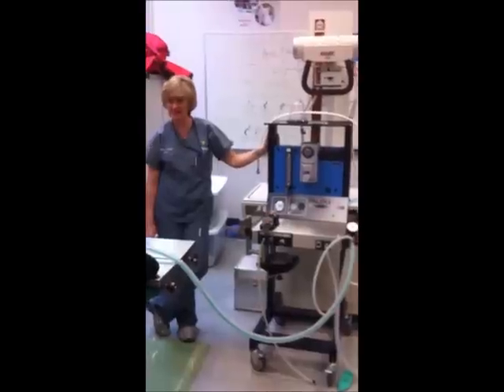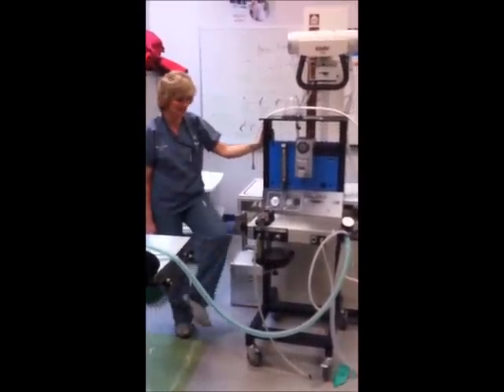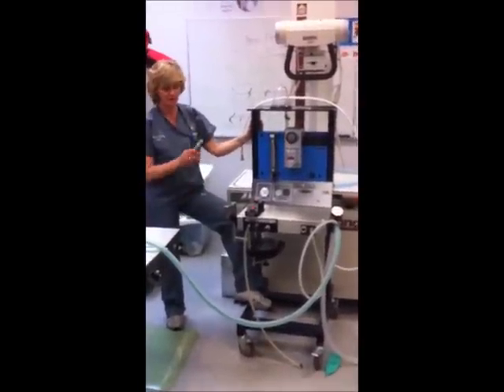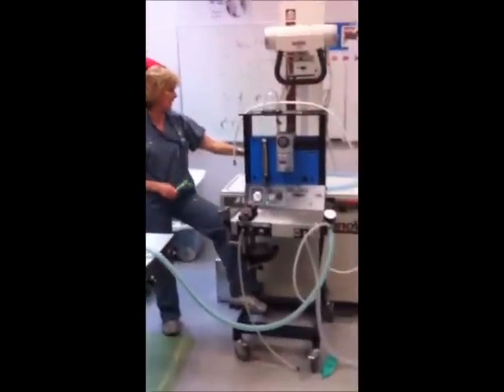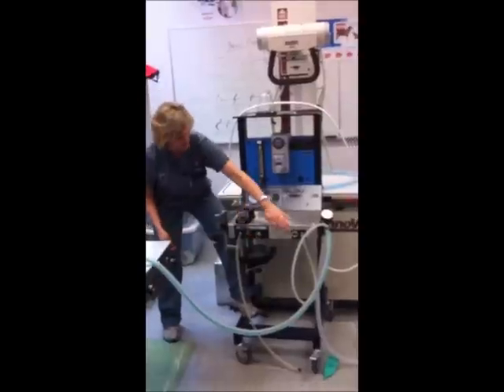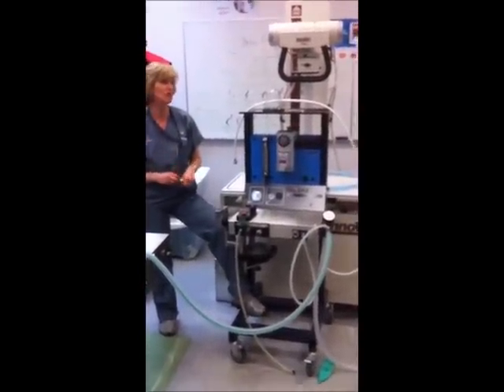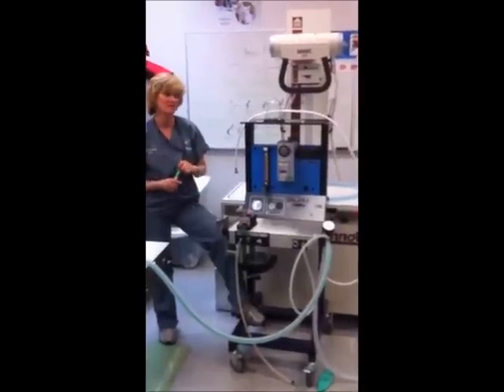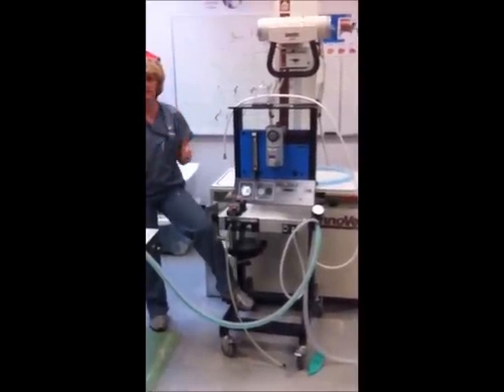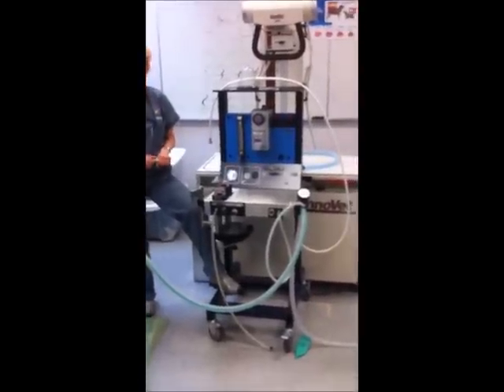Does that schematic help? Actually, just doing this again today helped. It's a little confusing, but I think that, like Carol said, it's easy though when you've done it 100 times. But really, it's not that much. You're hooking up a bag and 2 hoses. That's it. But you've got this and that and this, and I understand there's a lot to it. But I think the more you go through it, hopefully the clearer it gets. And that's why this was an open lab today. I find most of the time it helps to guide you, but ask any questions you have. Get them clear in your mind before it's time to write.